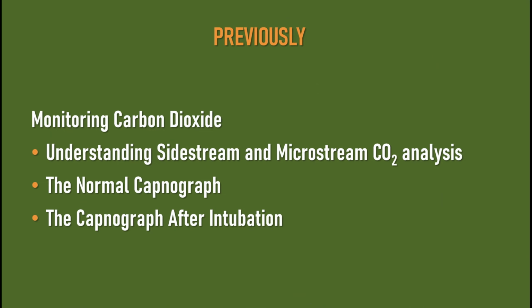In the previous tutorials, we looked at monitoring carbon dioxide, and I explained mainstream, side stream, and microstream CO2 analysis, the normal capnograph, and the capnograph after intubation. For most healthcare practitioners, that's all you need to know.